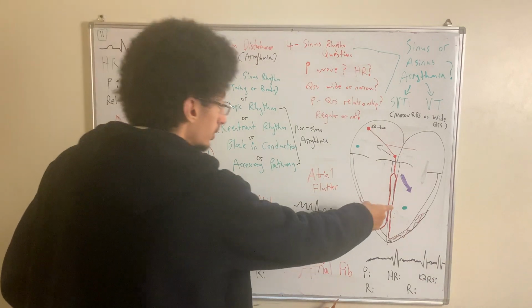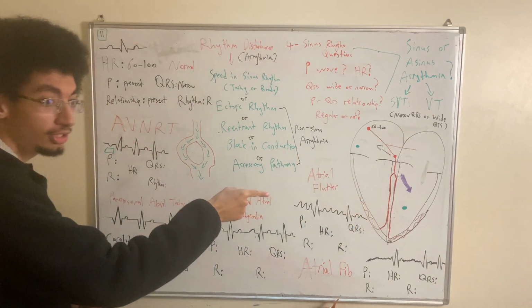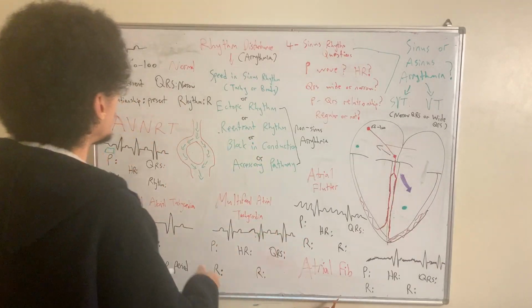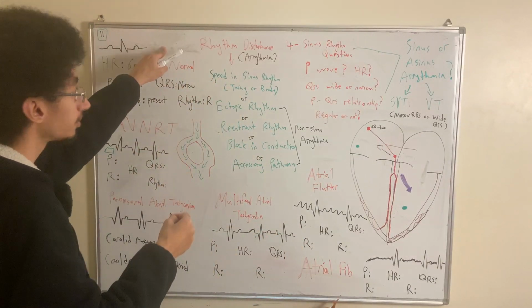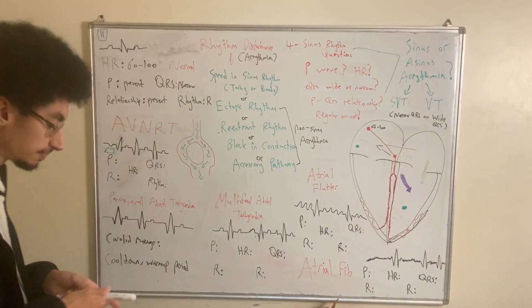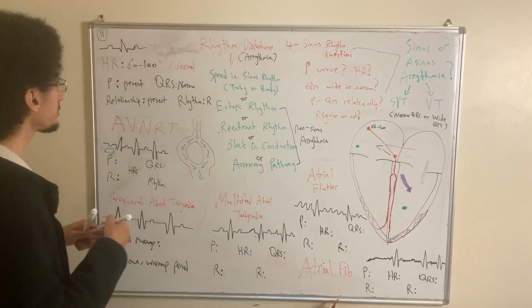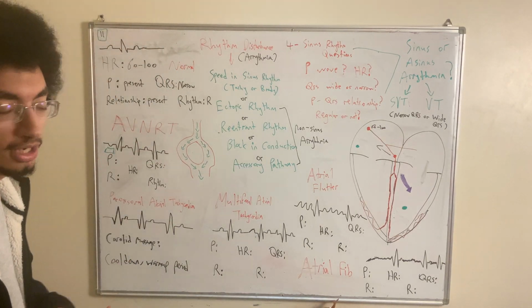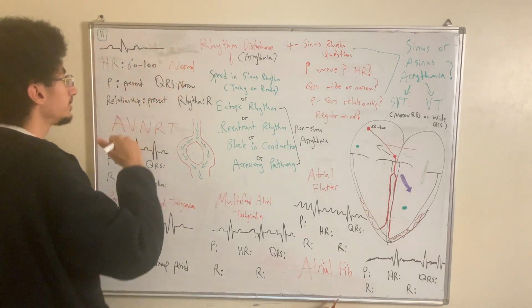But you see, on an EKG, there are two abnormal findings that will confirm that this beat, this rhythm that we will see, arises from the ventricles and not from anywhere else. For example, you might see a sinus arrest, okay? And then after some point, you might find this finding right here.